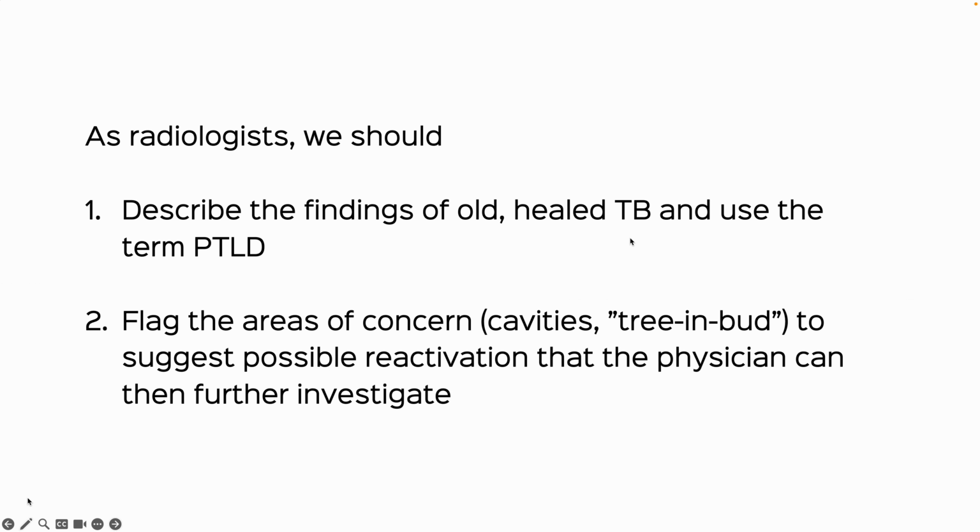And our job as radiologists, therefore, is to describe the background changes of PTLD and then flag the areas of concern. So, in the remarks, we should say that there are definite findings of PTLD, but there are areas of cavitary nodules and infectious bronchiolitis that are worrisome for the possibility of reactivation and should be further investigated. And then the physician can decide clinically whether it's worth going ahead, and if so, what are the methods they would use to further investigate.